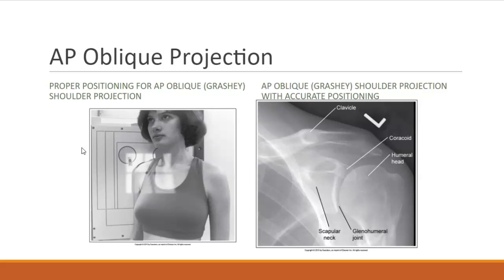The glenoid cavity should be demonstrated without thoracic superimposition. The clavicle is longitudinally foreshortened and is horizontally situated. In a patient who is lying down or recumbent, the glenoid cavity is situated slightly superior and the clavicle is foreshortened, aligned vertically and superimposing the scapular neck. The superior margin of the coracoid process is aligned with the superior margin of the glenoid cavity.